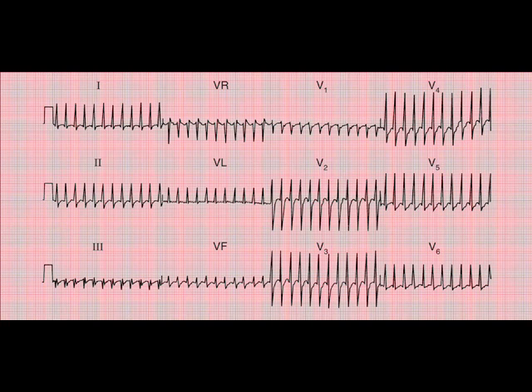Well, before you do the heart rate, you need to make sure that this is a regular rhythm. But I would say when rates are very high, even an irregular rhythm can appear regular. But you still need to measure for that. So place a piece of paper over the 12 lead, mark off one R wave, mark off the R wave next to it, move the paper along, and subsequent R waves should fit over those marks. Remembering, again, it can appear regular even when it's irregular in very high heart rates. Okay, we're presuming this is regular.